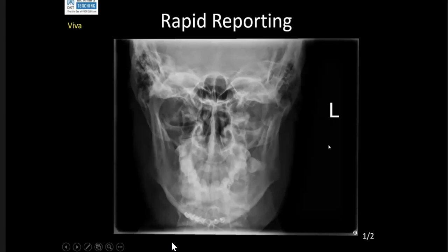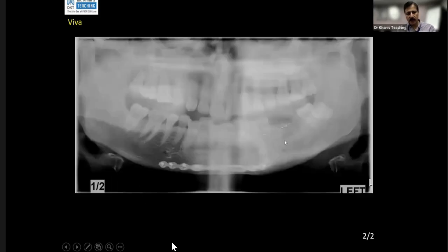Abnormal. There is left-sided temporomandibular joint dislocation. Excellent. So if you see here, this is the ramus and this is the condyle, something is abnormal, and this is sort of sitting here, displaced on itself. So if you compare right and left, then you pick it up. Yes, please. Normal or abnormal? So don't worry about this because we knew this. It's abnormal, left-sided TMJ dislocation.